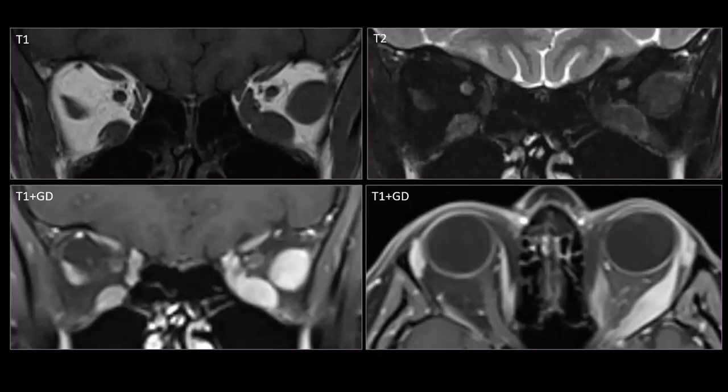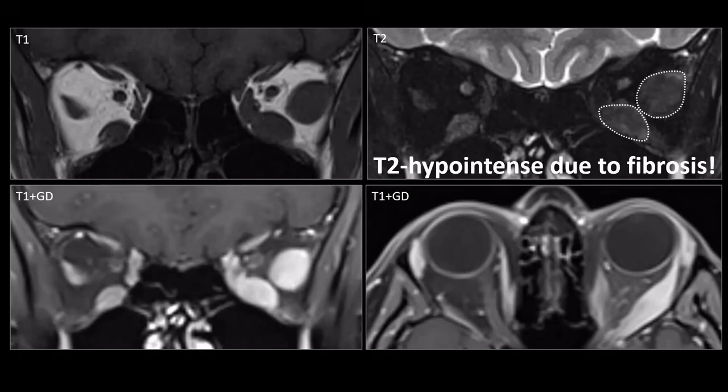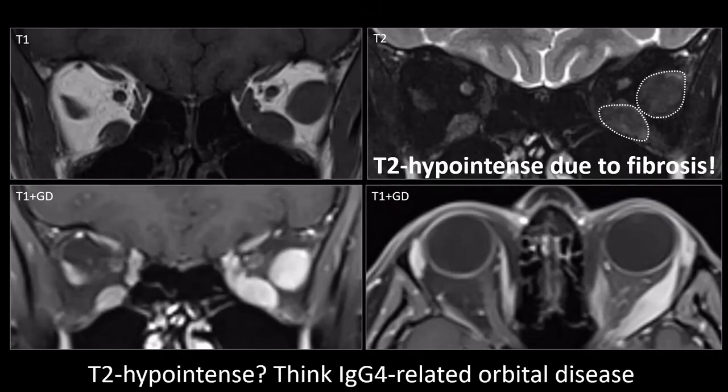Because we associate edema with acute pathology. But in this case, the muscle bellies are very, very hypointense on T2 weighted images. They are so hypointense because this is a disease associated with the formation of fibrosis, and fibrosis is hypointense or black on T2. What kind of disease causes this? Well, there's one thing that should jump to your mind immediately, and that is IgG4 related orbital disease.